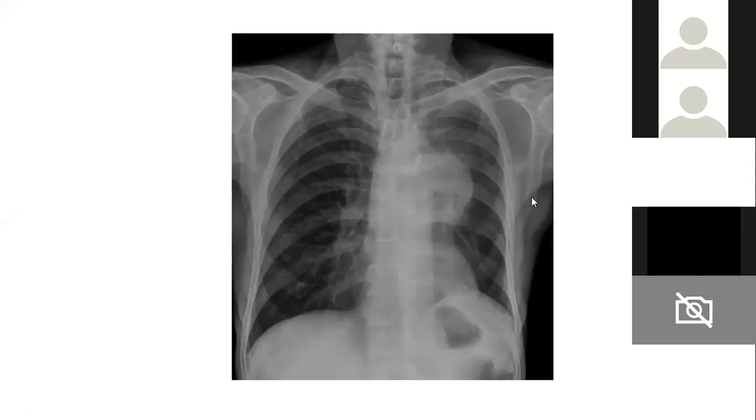So what about this? The same X-ray that we saw earlier, obtuse margins, right? So it's a mediastinal mass. And here we will again discuss the hilum overlay sign. The hilum appears to be hiding behind the mass. So, right, we can see the vessels traversing through the lesion.